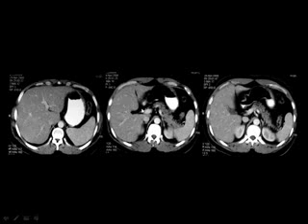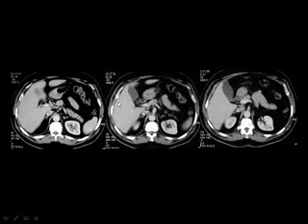And this is the stomach, this is the liver, this is the aorta, and this is the inferior vena cava. Here you can see in this area the porta hepatis, where you can see the portal vein. And you know that the liver tissue which is located between the portal vein and the inferior vena cava is known as the caudate lobe. Then if you go down, you can see the gallbladder, and you see the liver as well.